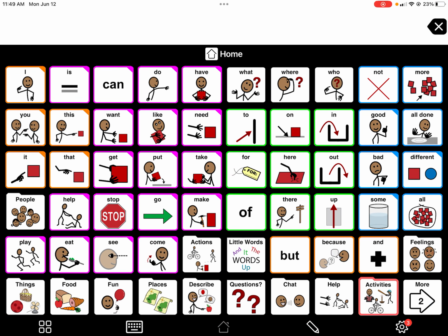This is a really important step that I always like to do before I give the student the iPad, just because they are very intelligent and they will edit things and you won't even know where to start once those things are edited. So feel free to use this tip.